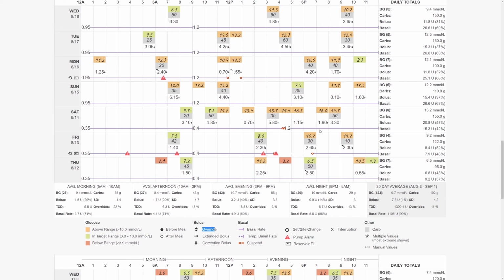You'll notice that there are several different fonts displayed. For instance, this font, which appears in italics and almost handwritten, whereas we have this font below, which is a standard Arial font. You'll see that that italicized font that looks almost handwritten actually displays manually entered values. So all these blood glucose readings are manually entered blood glucose readings that were input into the pump itself.